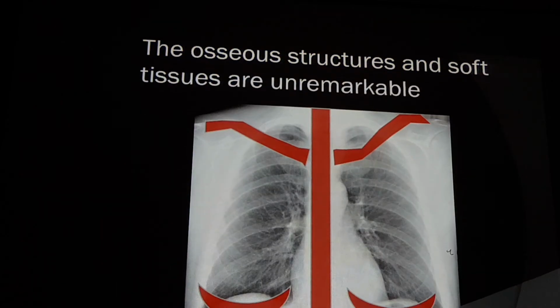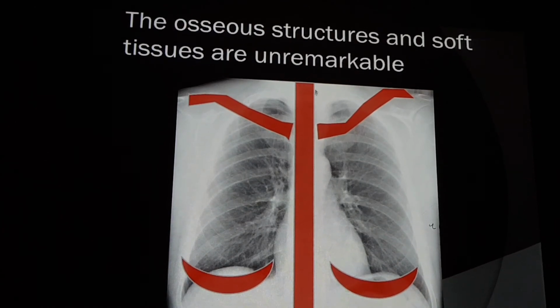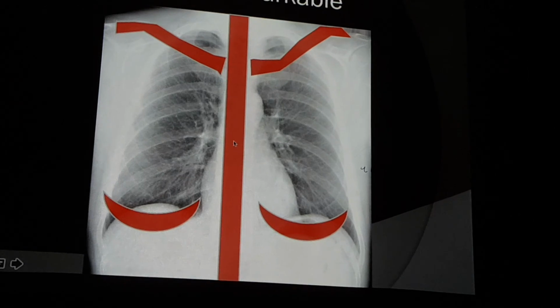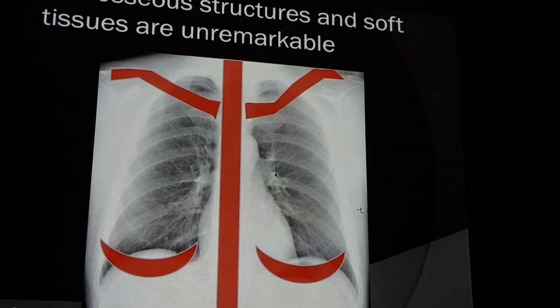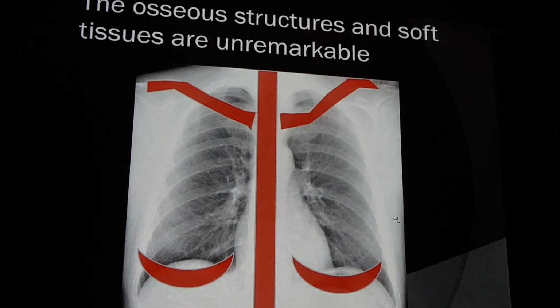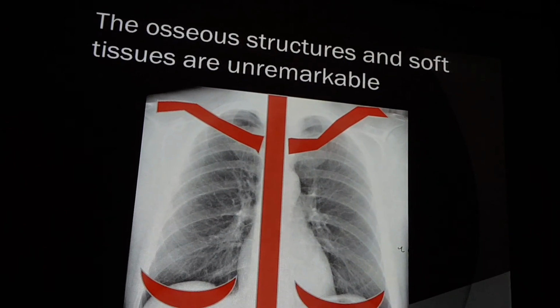Other radiologists have different templates. They go midline first and then go out. Some would prefer to start with the aorta, the heart, and then go to the lungs. But me personally, I go to what I think is most important first, or to what clinical finding is most important first, because these are the things that I must communicate to the clinician.